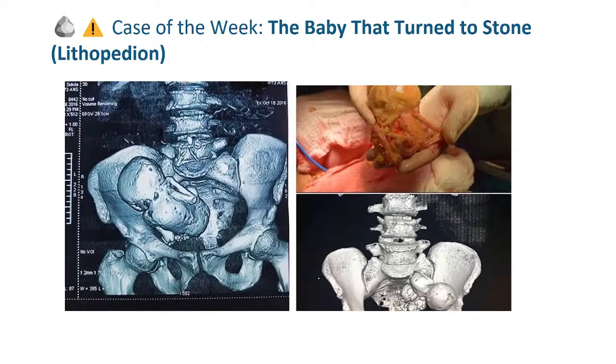Today's case is one of the rarest and most fascinating conditions ever reported in medical imaging. It is so uncommon that many radiologists, sonographers, and gynecologists may never encounter a single case throughout their entire careers. Imagine a woman who became pregnant, lost the pregnancy decades ago, and unknowingly carried the remains inside the abdomen for more than 35 years. Instead of being expelled or absorbed by the body, the fetus gradually became converted into calcium, creating what is known as lithopedion, or the stone baby.